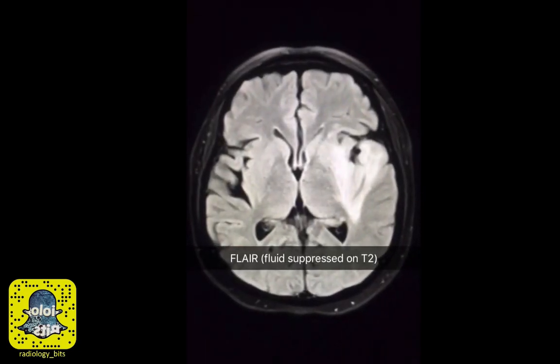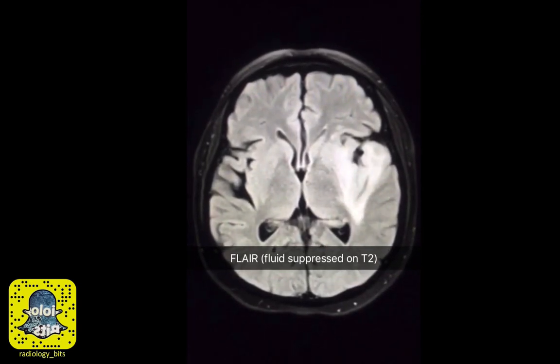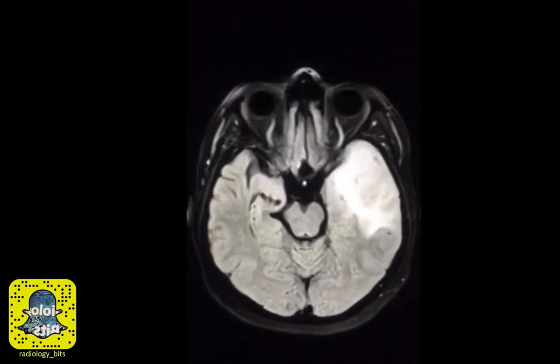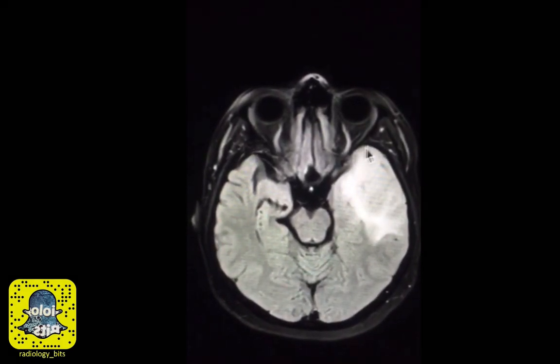This sequence where CSF is suppressed on T2 is called FLAIR. Now, as we mentioned before, the lesion is involving the temporal lobe. It exerts mass effect by effacement of the sulci and the CSF spaces.